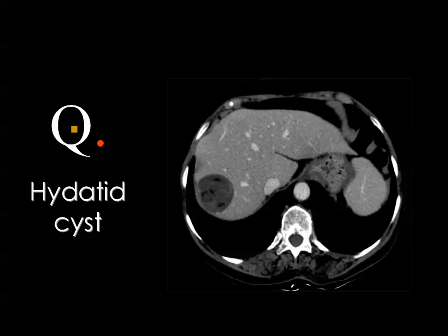Okay, how can you predict this possibility? Actually, the main diagnostic criteria are lacking here: no calcium, no floating shadows, and no internal cysts. Then you have to decide first, is this lesion a cystic or solid lesion? If you look carefully here you see fluid density. If this is a solid lesion, it will show some enhancement, maybe. And the presence of fat is not one of the criteria of hydatid disease.